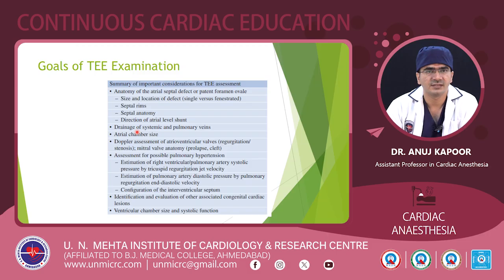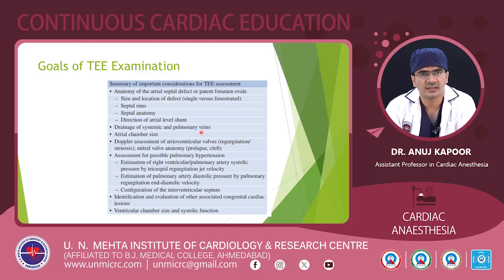Secondly, we will have to assess the drainage of the systemic and the pulmonary veins, especially in a sinus venosus defect. We will have to assess whether the pulmonary veins are draining into the LA, or there can be an anomalous drainage of the right pulmonary vein into the RA, which can lead to deoxygenation or poor oxygenation.